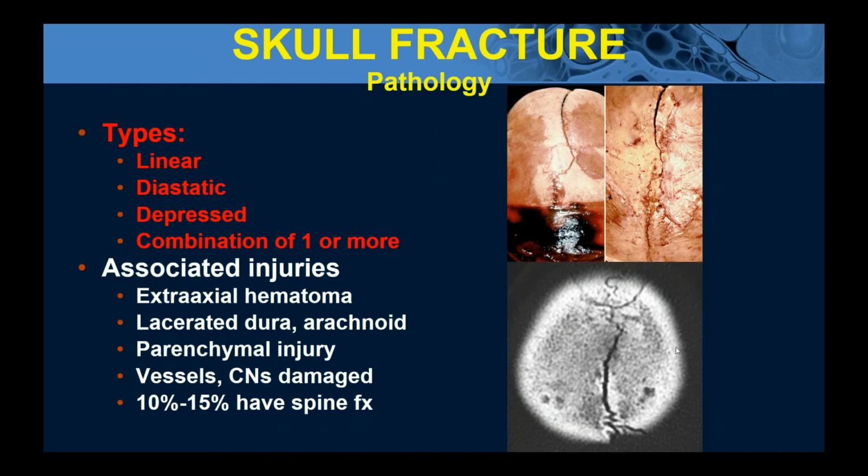So if you look at the bone CT scan, that's what this white circle is below. That's the top of the skull in another patient, not the patient who died. That's an autopsy case, obviously, above. But we see here skull fractures in the front and the back that extend into the sagittal suture, and you can see the sagittal suture is spread apart. It's diastatic. And so this would be a combination of two different types of skull fractures, linear and diastatic.